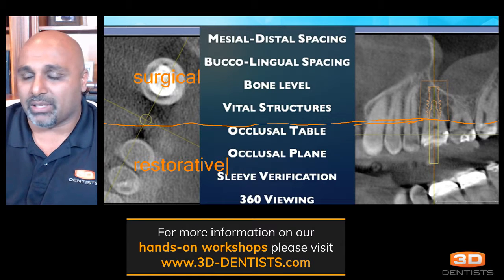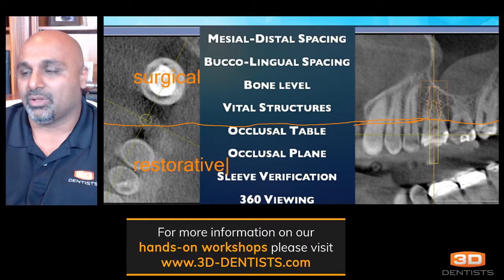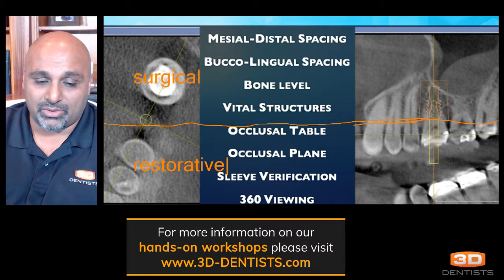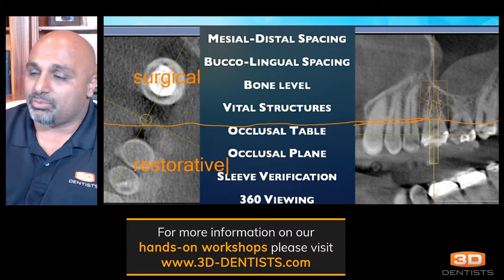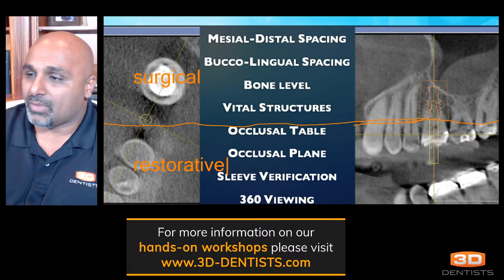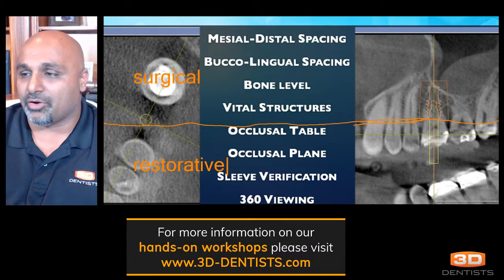So we know that we want to place our implant 3 millimeters apical to our proposed gingival margin, and if our gingival margin is going to be changing due to, you know, a short tooth or retained primary tooth or a congenitally missing tooth, or due to trauma from an extraction for immediate placement, we need to be mindful of placing that. So, you know, placing our implant 3 millimeters from the proposed gingival margin, not necessarily the current gingival margin.